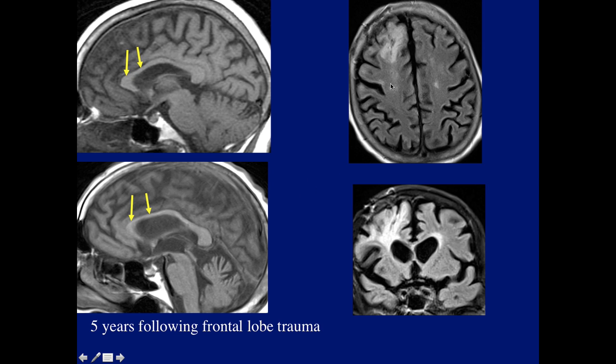And we can see why. This patient had severe trauma, and look at the damage involving the right hemisphere here with tremendous gliosis, so this would involve the fibers that leave this region with Wallerian degeneration, and so that's why the corpus callosum looks so thin, which usually people don't comment on when they read, but that's a definite finding.